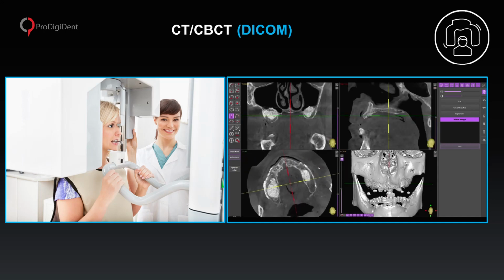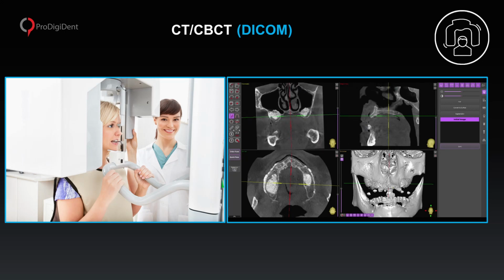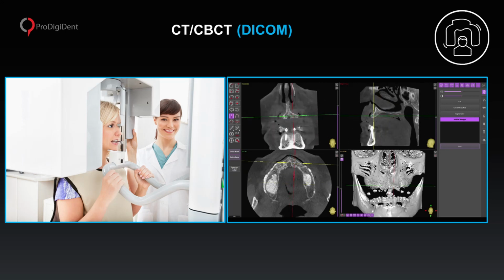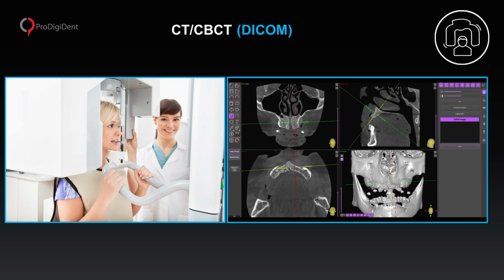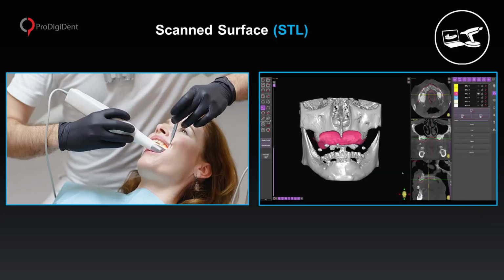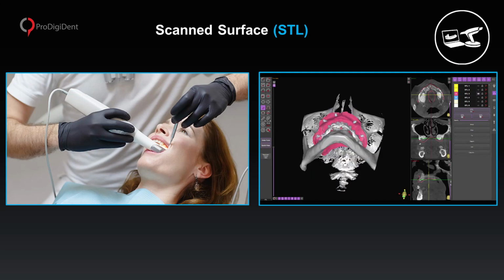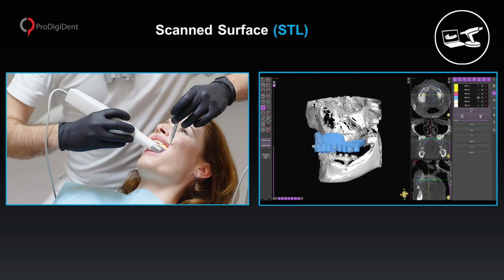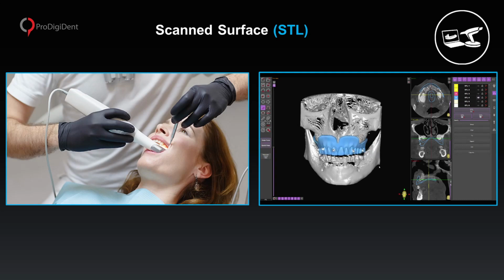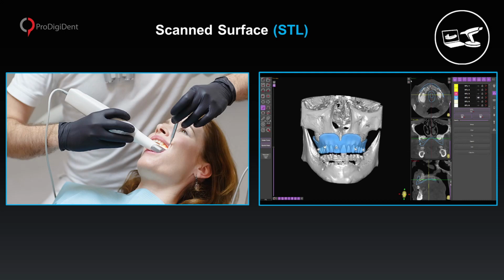Utilizing ImplaStation software, the diagnostic information for implant planning can be fully appreciated in all of the necessary views, including cross-sectional, coronal, sagittal and axial, and in 3D reconstructed surface models. The diagnostic phase is greatly enhanced when the existing intraoral condition can be captured with either an analog or a digital method. The fully digital method utilizes an intraoral scanner to directly digitize the oral condition.